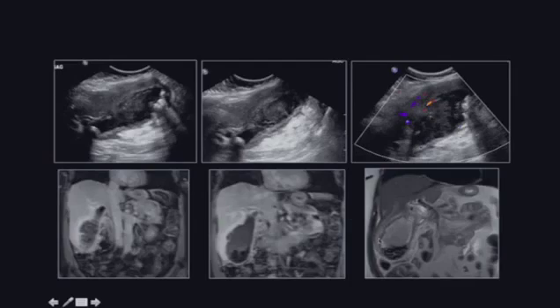Here we see the typical double-layered gallbladder wall edema, more consistent with an inflammatory process, gallstones, and contrast-enhanced studies show this intense hyperemic change within the adjacent hepatic parenchyma, a very helpful sign of acute inflammation, and also these little septa within the lumen of the gallbladder representing sloughed mucosa of acute complicated gangrenous cholecystitis.